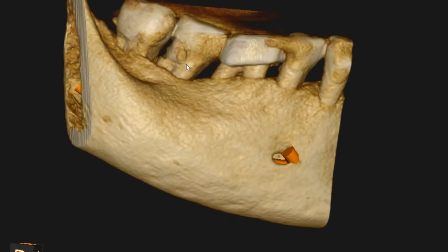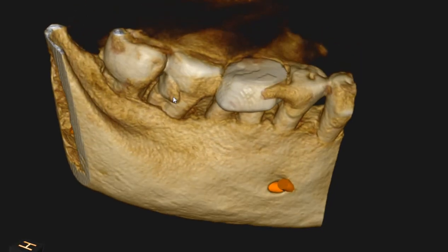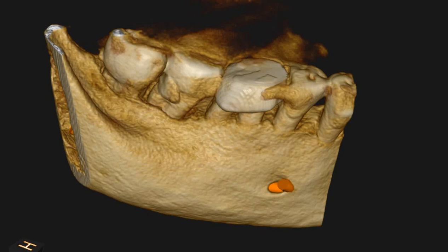This is the bone level of the 6, whereas at the 7, if this tooth was not fused, the furcation would definitely have been involved. Now we will show you each and every segment.